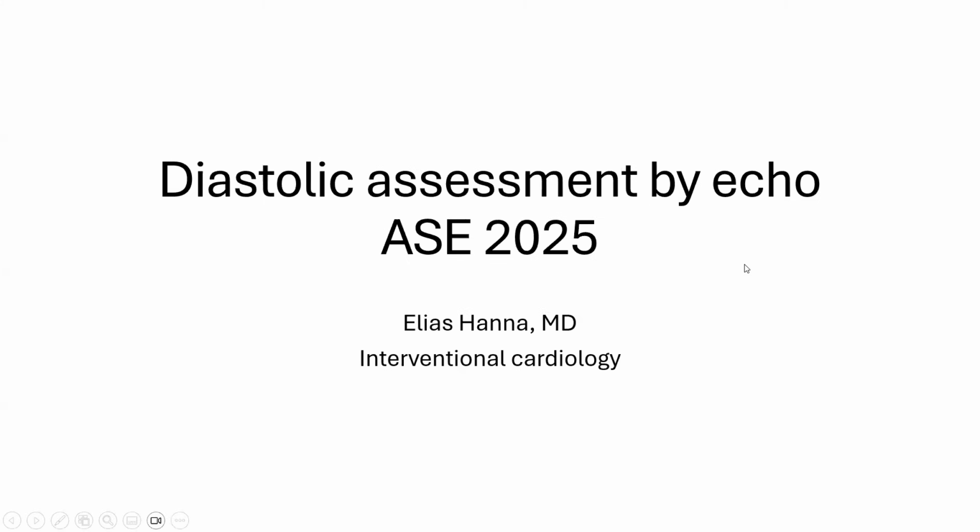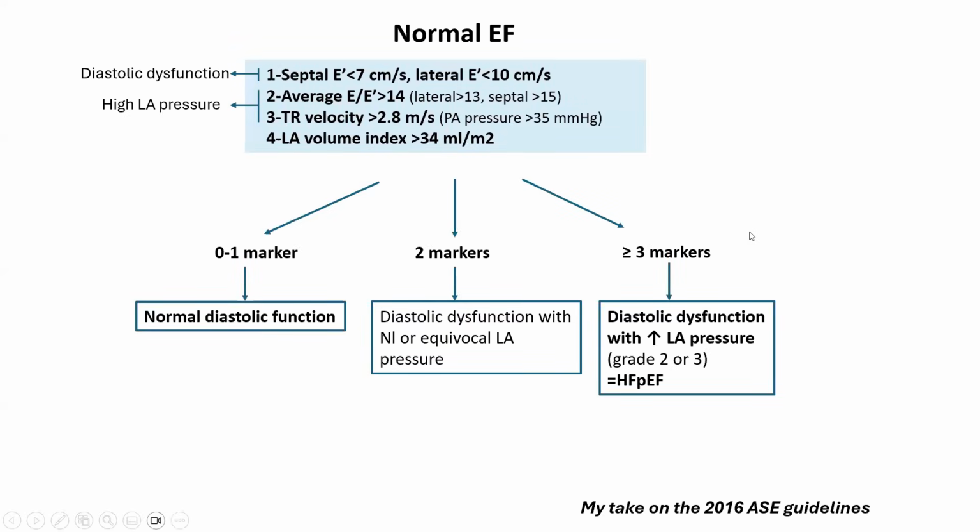I will talk today about the diastolic assessment by echocardiography, and I will focus on the updated ASE guidelines in a summarized fashion. First, I'd like to start with the 2016 guidelines, which I liked, which were more straightforward.